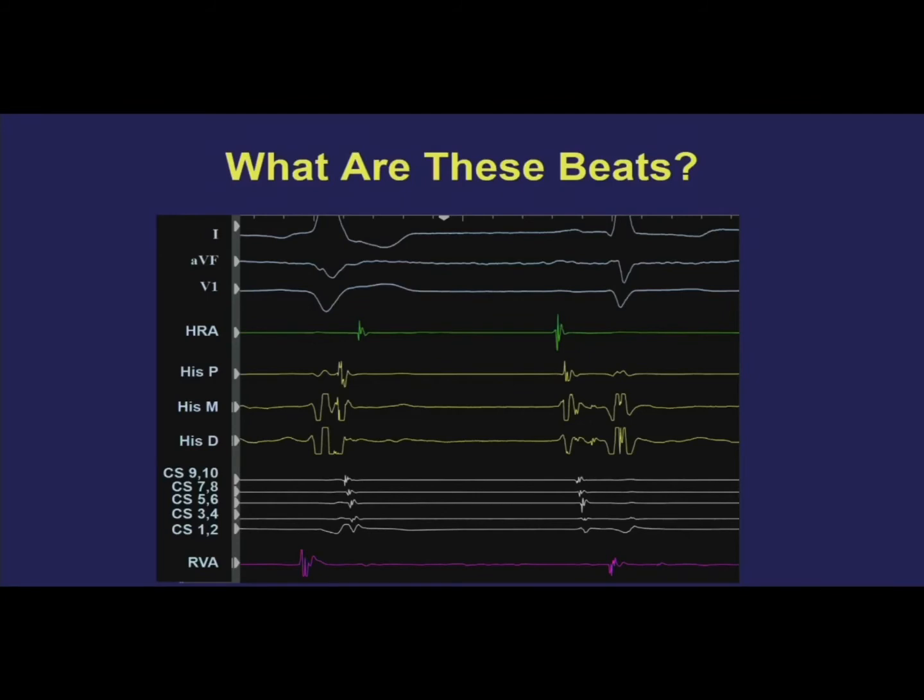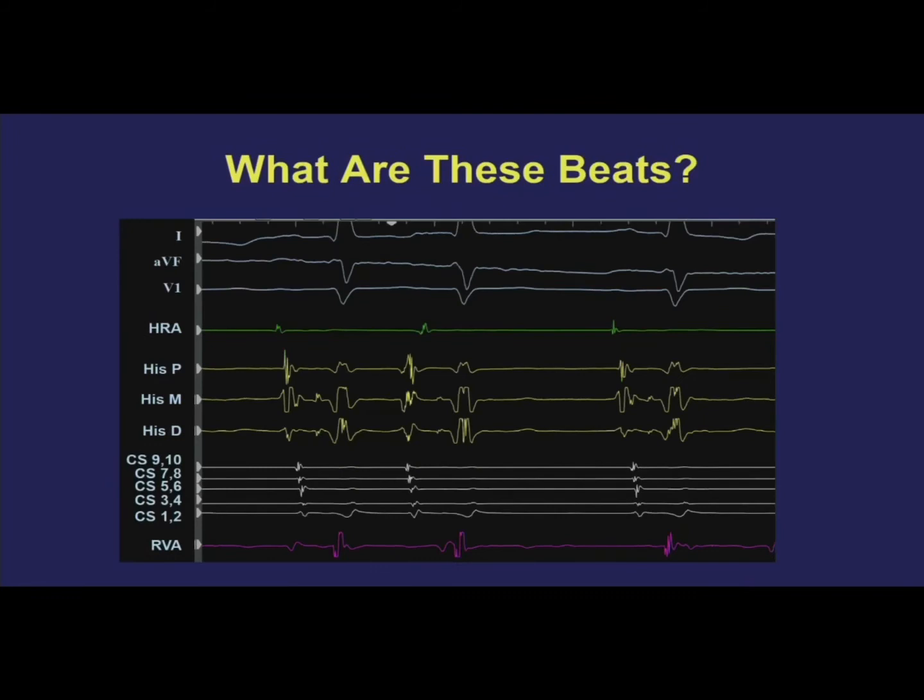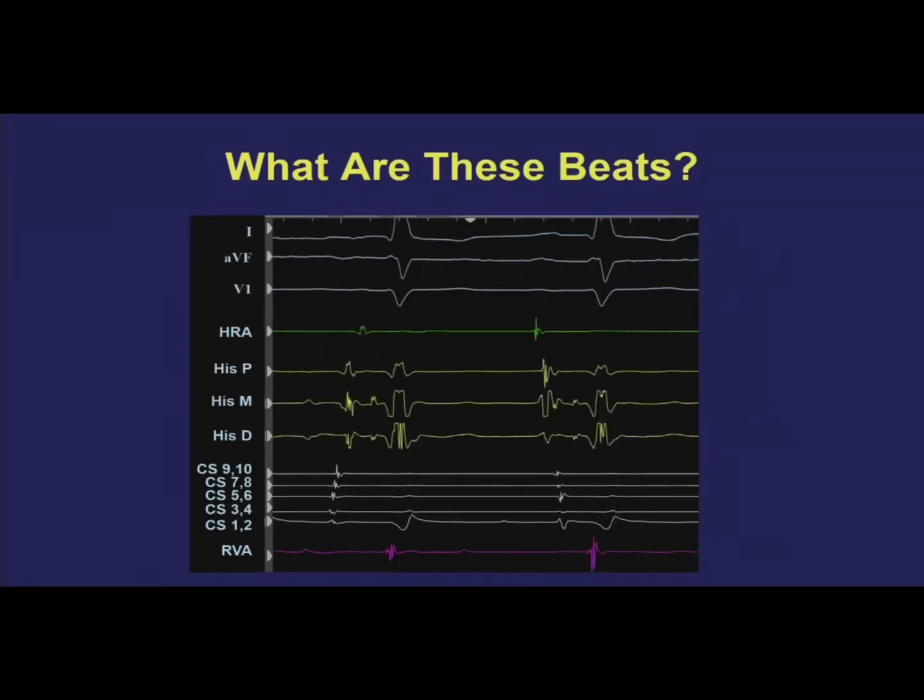Some people do EP studies without a high right atrial catheter. It's one more catheter. It's helpful sometimes, especially early on. All right? I know we went through that in a lot of detail, but I think it's really important as you are building a foundation. And if we don't get through all my slides, who cares? The point here is to just get familiar with looking at these recordings. I'm going to skip that, and I'm going to go to this one, and we'll cover a couple more things, and we won't cover all my stuff, but that's okay.